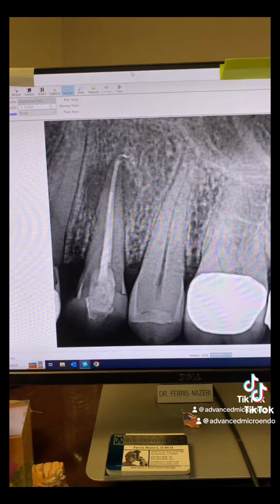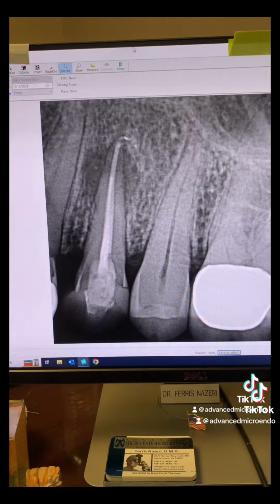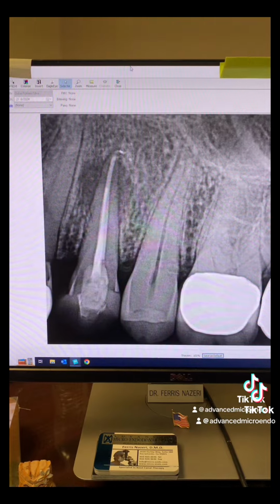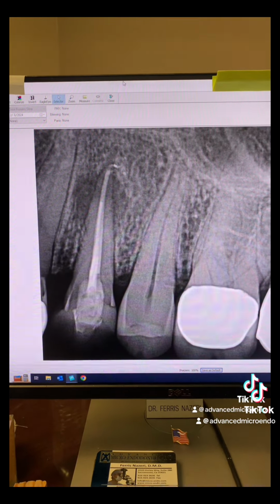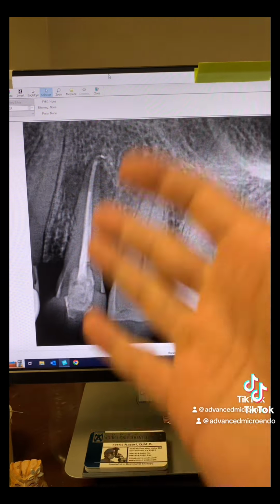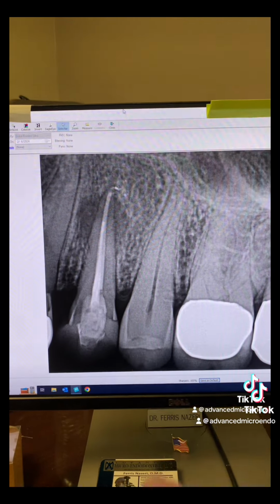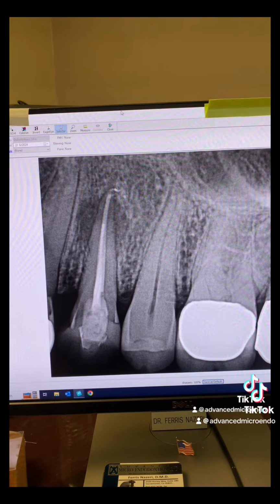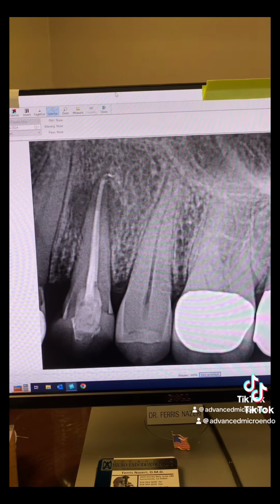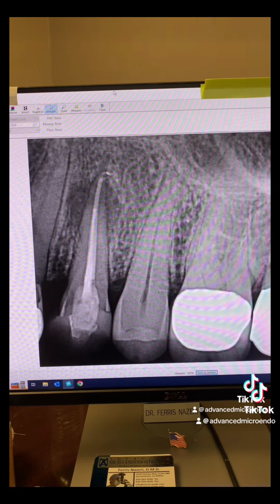All right. So if I just rely on one angulation PA and want to make a diagnosis, my diagnosis will be wrong, and the patient will suffer, not only financially, but also emotionally and physically. Okay. And of course, the treatment or retreatment in this case won't work. Take a look here. The tooth was very tender to percussion and palpation. Mobility was slight, but still within normal limits.